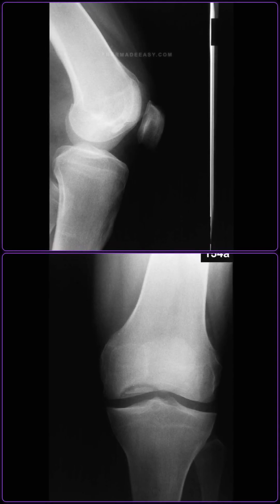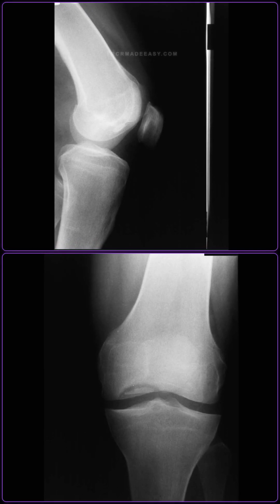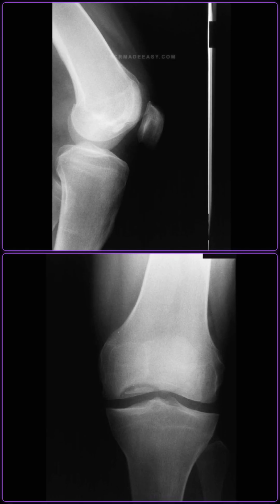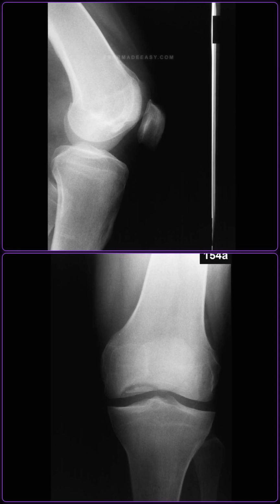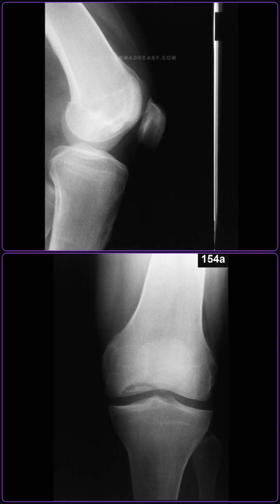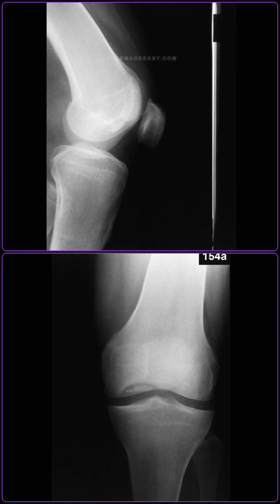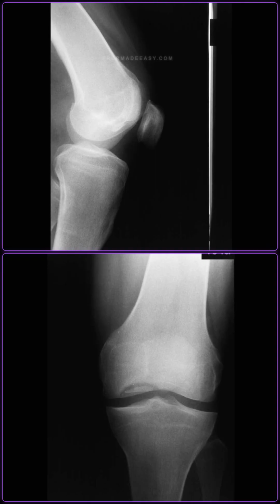Within this subchondral defect lies a separate sclerotic bone fragment surrounded by a thin, lucent halo. There is no major joint space narrowing and no secondary degenerative osteoarthritis is identified. The location of the subchondral defect and the presence of the in-situ osteochondral fragment in a young male are highly characteristic of osteochondritis dissecans. What is the differential diagnosis for a focal femoral condyle defect, and how do we differentiate them?